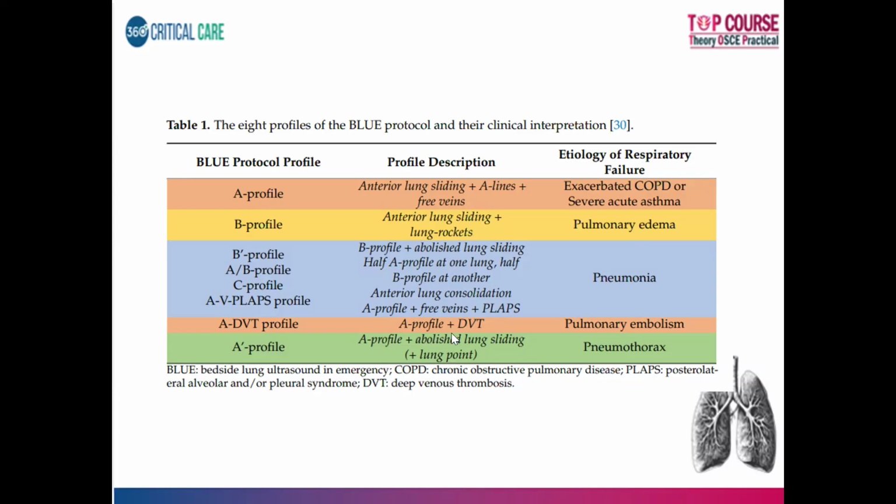Okay, so this is what we see in the BLUE protocol. Usually it rules out the presence of a pulmonary edema. Okay, so if the patient comes with respiratory distress and the patient is asthmatic, this is what we can anticipate in the lung ultrasound.